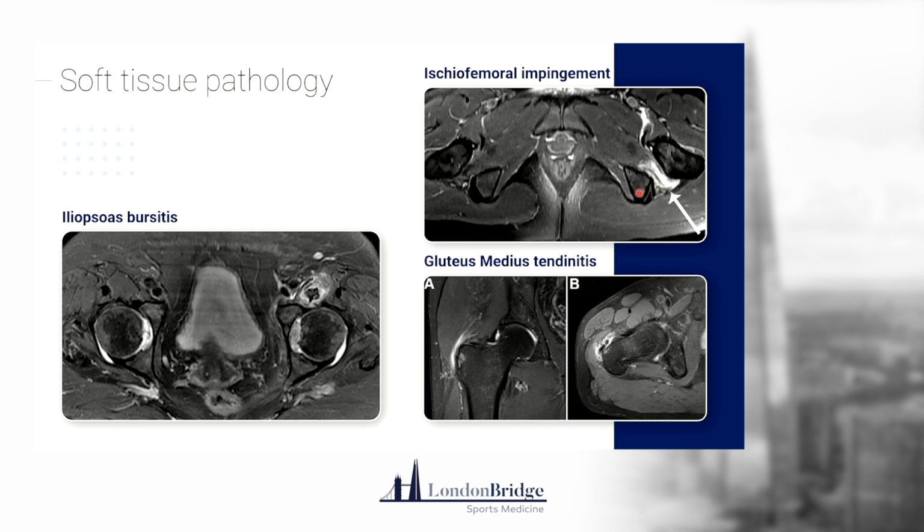So this is the ischium here, and this is the space in between the ischium and the femur. So if it was a true ischial bursitis, you'd be seeing lots of fluid around here and edema within hamstring origin, but this is in between. So all your short external rotators, quadratus femoris, the gemelli, all that kind of stuff are going to be inflamed from that point of view.